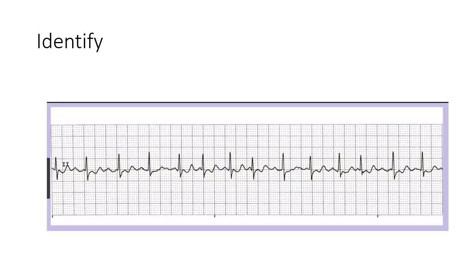Is the PR interval normal or a little longer than normal? Oh no, you tell me. If you look at that PR interval, there's your P wave. Don't get misled by that little blip there. As you compare it, here's your P wave, PR interval. There's your P wave, PR interval. The other thing I'd ask you to look at in this one is, is the PR interval constant? No, it looks like it starts longer and then it gets shorter. I will tell you it does. It varies.